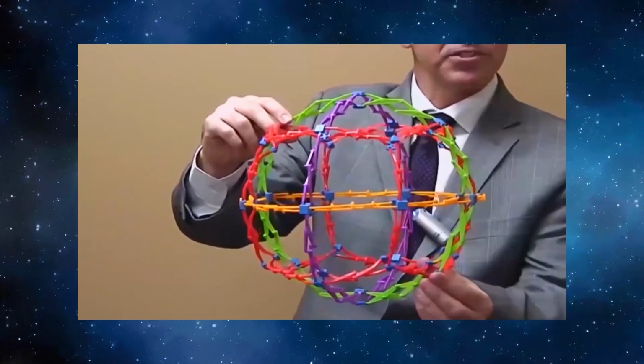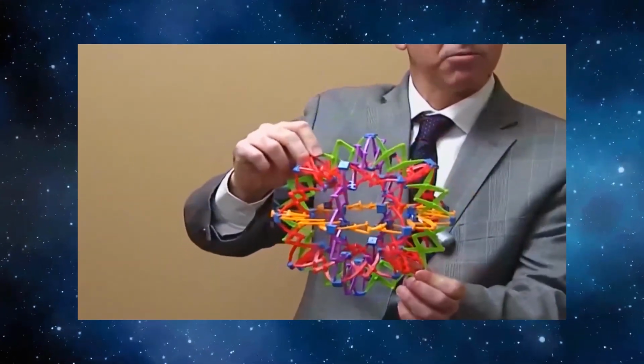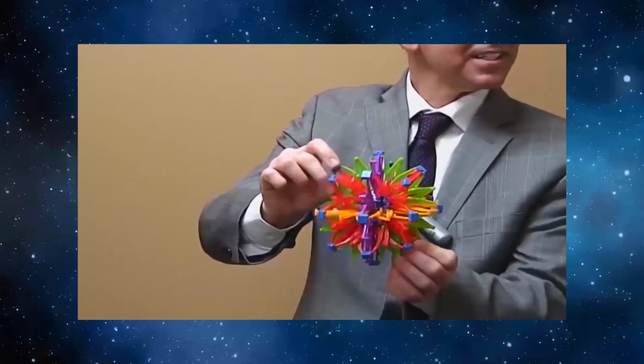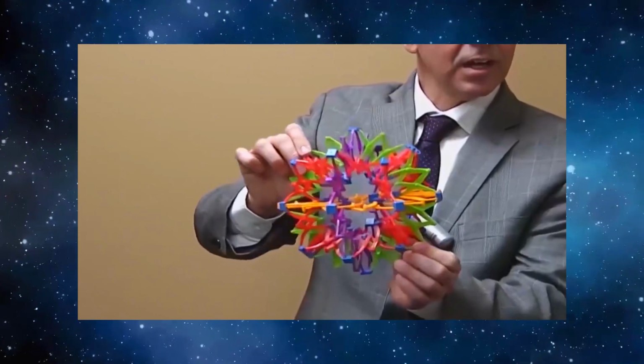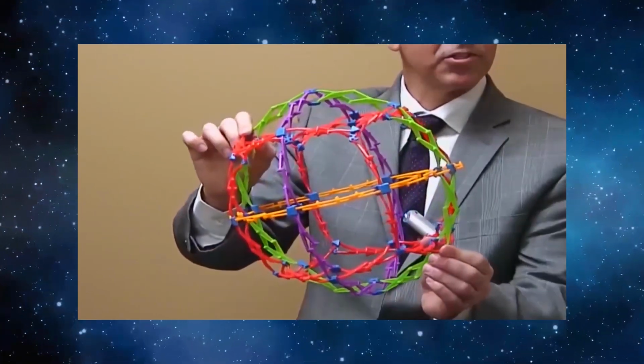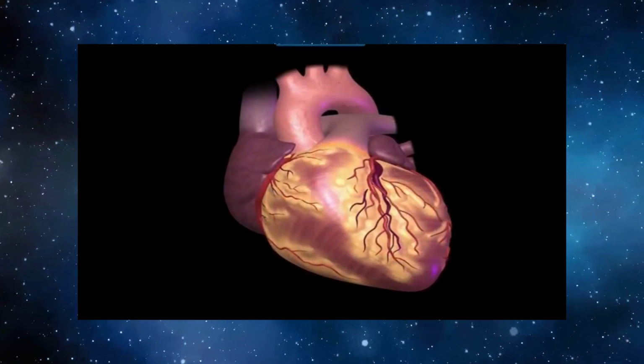So what happens to the circumference of the sphere as we contract down? It gets smaller. So how are we going to describe that? We're going to say it's experiencing negative circumferential strain as it contracts down, and positive circumferential strain as it expands back out. So this is going to be no surprise to anyone.